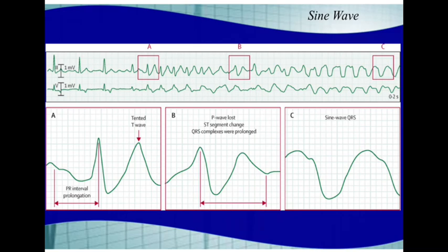So what most people know when it comes to high potassium levels is that it causes peaked T waves on a 12-lead EKG, but that's usually elevated potassium levels, but not as severe as what you see with a sine wave. So I'll talk to you a little bit about the evolution of hyperkalemia on an EKG.